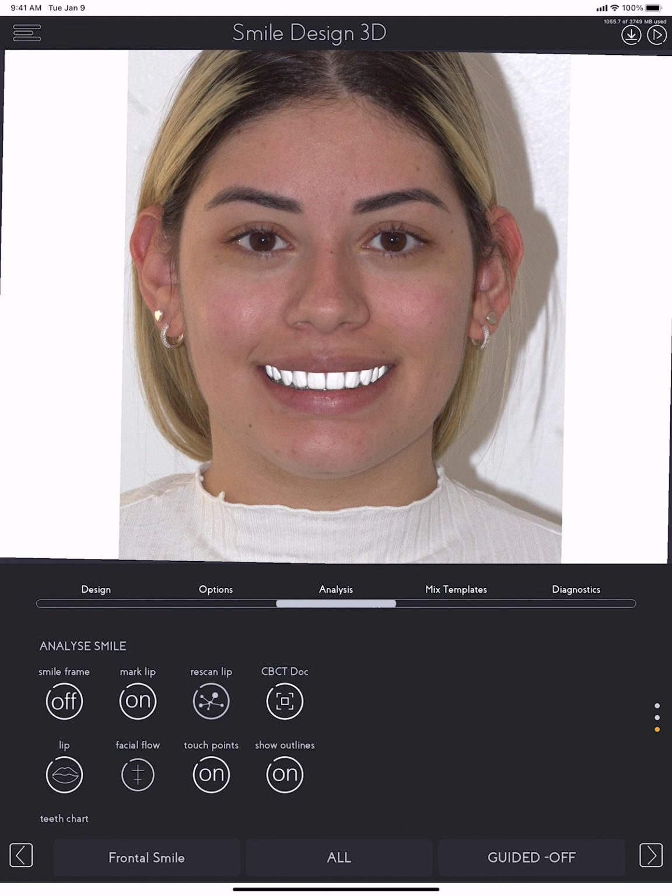As you can see in this photo, for example, you can't really see the gingival margin. But from a periodontal standpoint, it is important for you to respect the biological width. And this is why we're going to be focusing now on the periodontal part of it. So let's remove the simulation. Let's bring the opacity back. And now let's tap on Analysis.